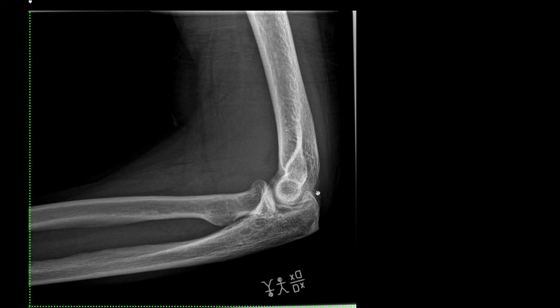So here's the next patient. What do we see? If we look carefully, there is a sail sign here, correctly. Maybe one here in the back. Do you see anything amazingly obvious? Personally, I missed this fracture, so I will never forget this. But let's see what we have.